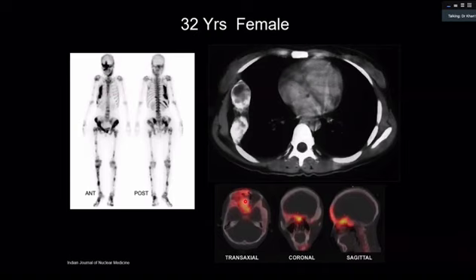Again, this is a SPECT nuclear scan, which has got uptake there. This sign in literature is known as the pirate sign. You can make out a pirate. You see this. So pirate sign. So this is the sphenoid wing.